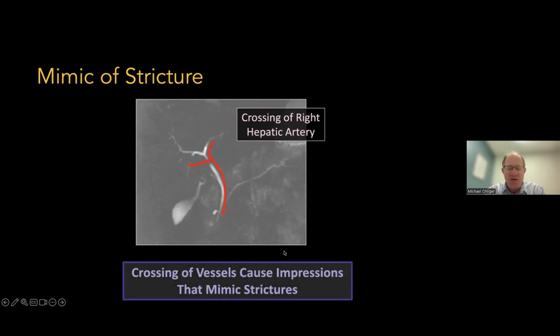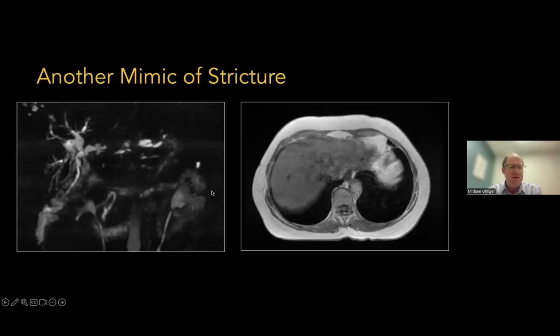And the reason we see this in the transplant donors is that your transplant donor patients, because they're young and healthy, are going to have the nicest MRCPs that you see. So often you can see this very high resolution, and you're going to be able to see them.